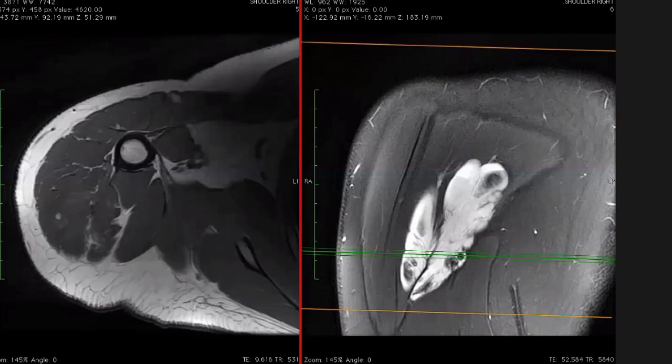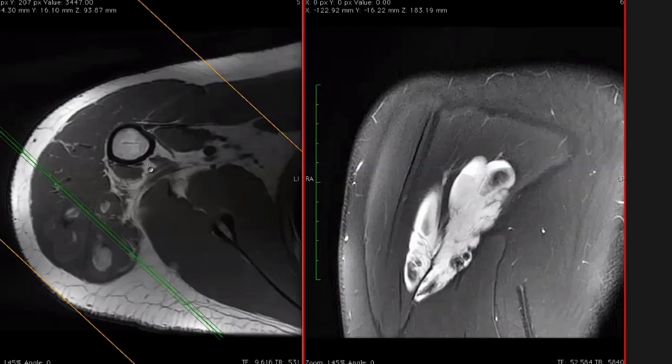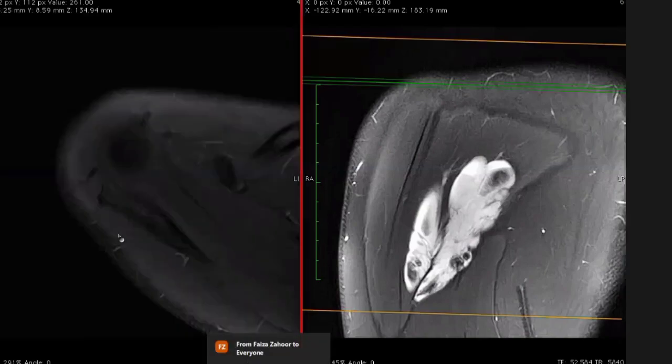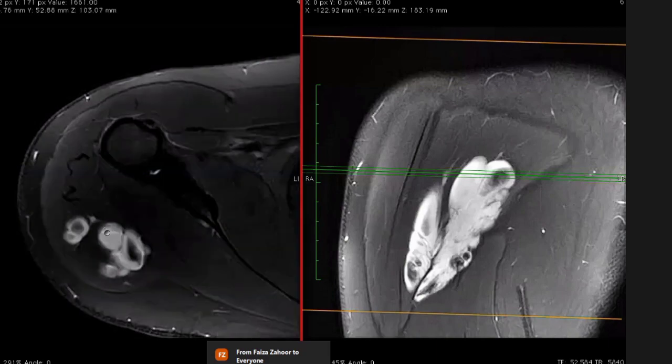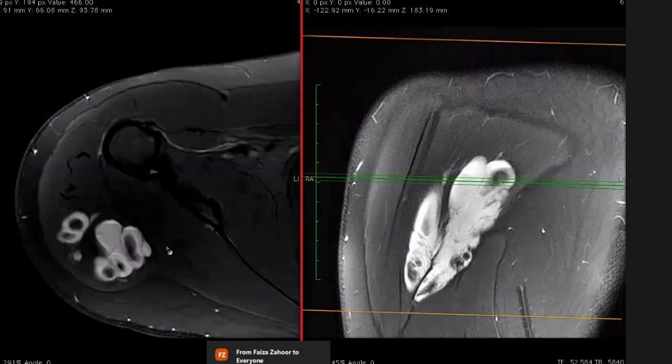All right. So any ideas what this could be? Or do you want to see a post-contrast? Post-contrast will define it. What do you think about this? Level, exactly. So there is a fluid level. All of you can see that? There is a fluid level, right? What does that mean? It means intracystic hemorrhage, blood products of different ages, right? Yes, various ages. And there as well, there is this kind of fluid level.